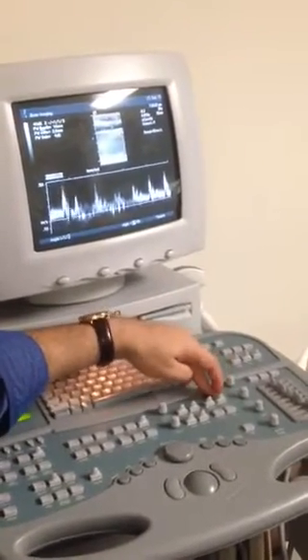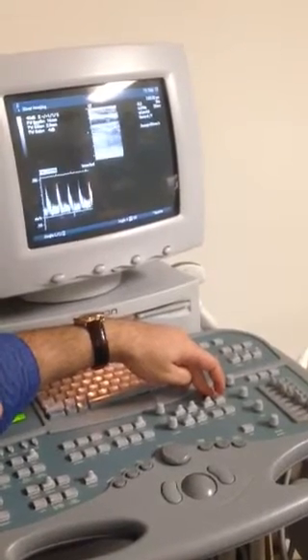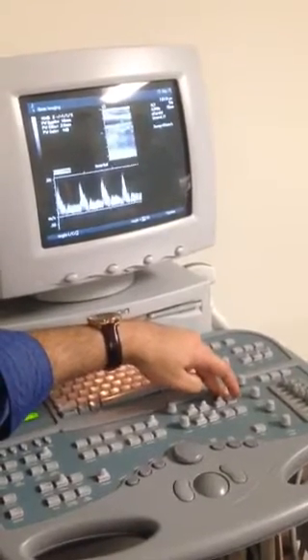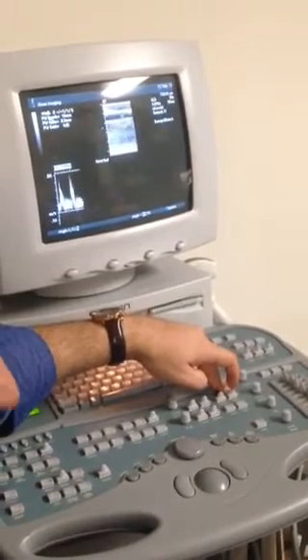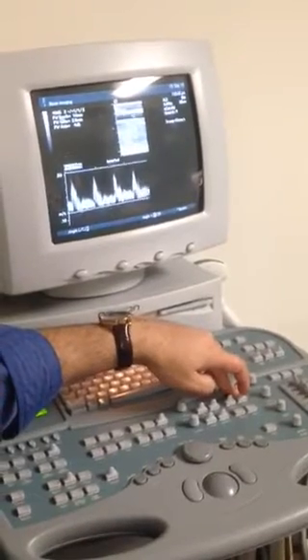Very good. Now watch. What happened to it? Okay, now it's normal. That's what's called normal. Now we're going to slow it down. You see it? It's too slow. Back to normal. Now we're going to do it faster. Watch.